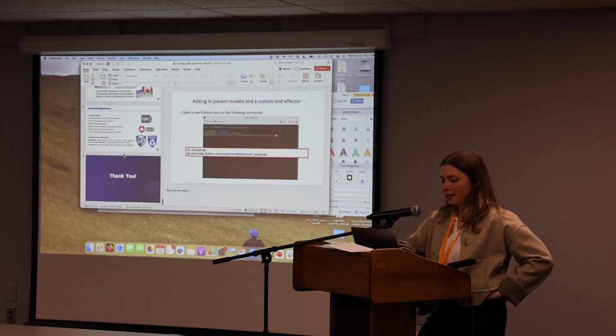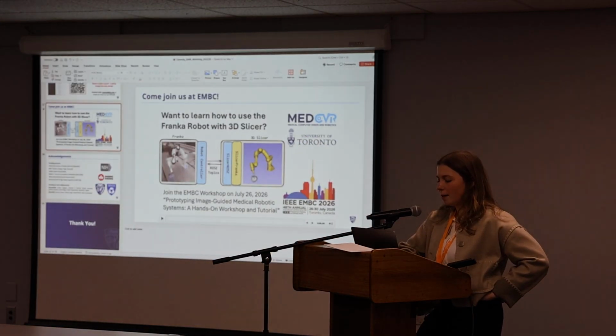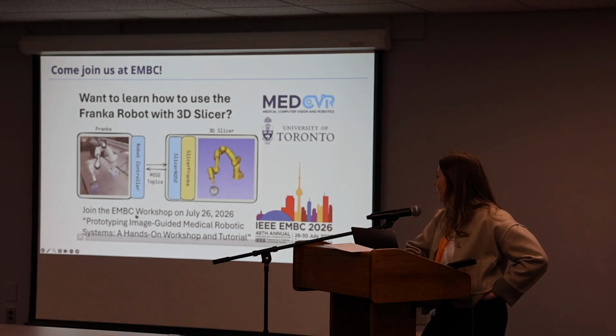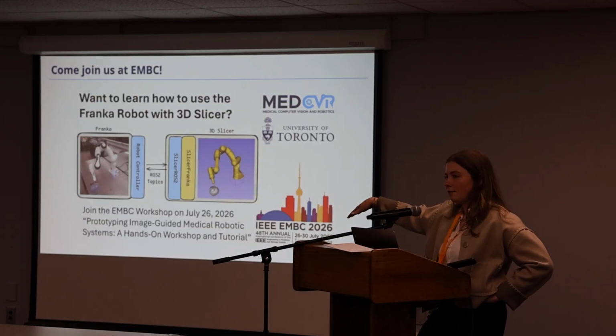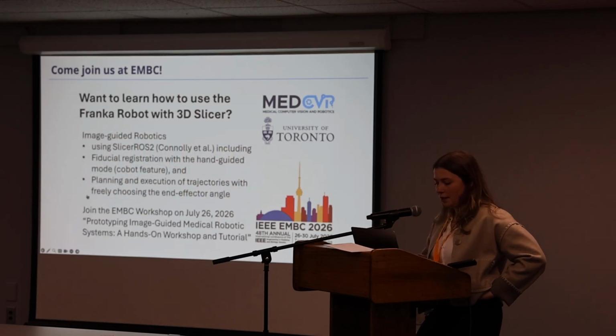The cool part I can show you guys as well: we have this other group that has taken... we're trying to bake things directly into SlicerROS as much as possible. This is a group from Toronto. We're doing another workshop with them actually at EMBC if anyone's planning to go. They've taken the module and customized it for the Franka robot because they use it for classes. They define trajectories based on anatomy. It's really SlicerROS2 under the hood.